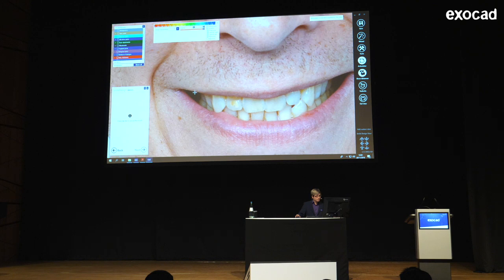And at that moment, I would actually like to thank Paul for his beautiful smile for this case, because he has not the normalest of lip lines, to be honest, and I don't mean that in a rude way, because it's really fun to work on a case that's not the complete standard case, where you really see why you need smile design for some cases. In a completely normal generic case for demonstrations, you wouldn't even need smile design because you can just place the teeth perfectly by hand.